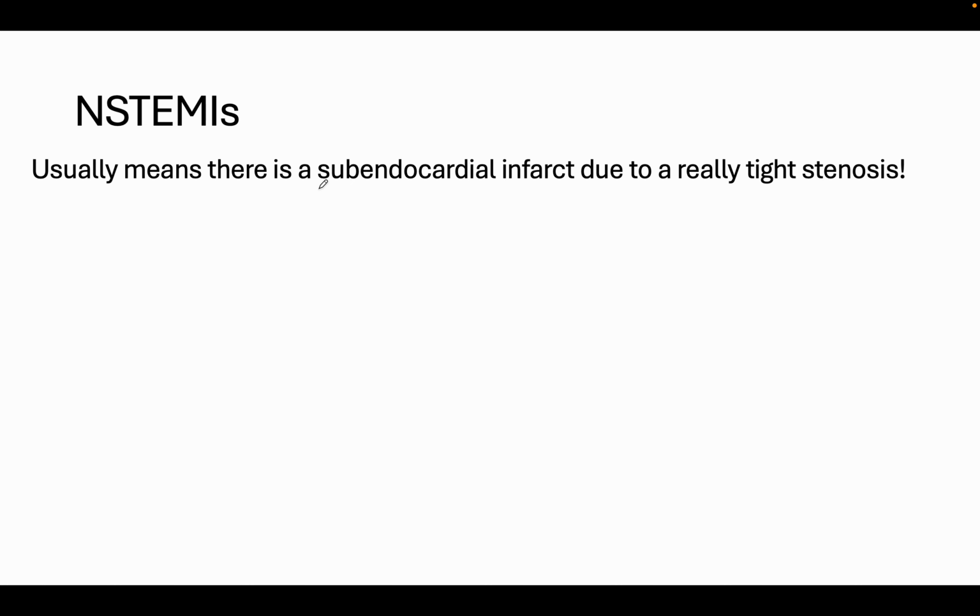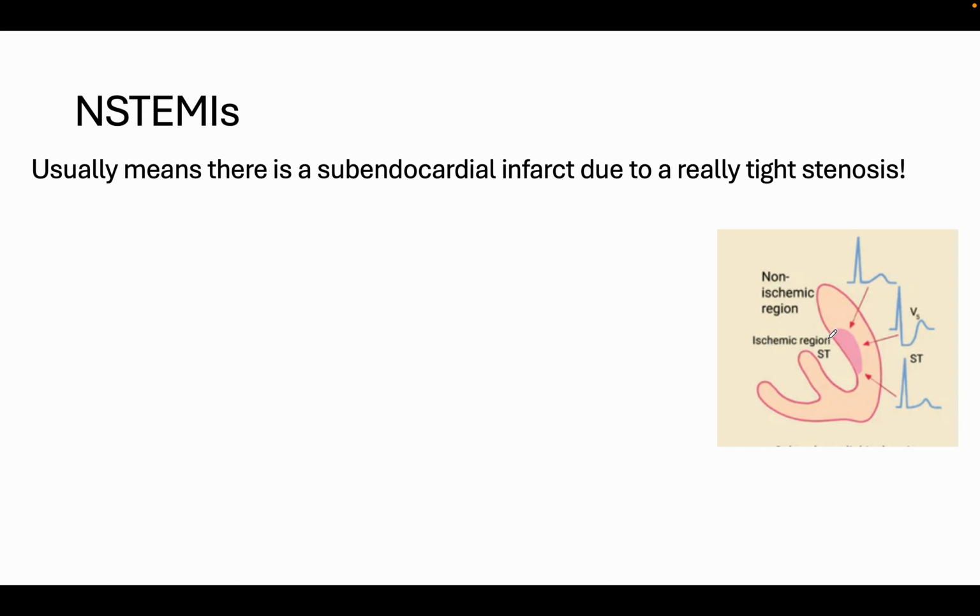So let's now look at the concept of an NSTEMI, a non-ST elevation myocardial infarction, which, as the name suggests, is a myocardial infarction where you don't get any elevation. And this suggests a subendocardial infarct, which is not a full thickness infarct, but a partial infarct through the wall of the myocardium. And that's really suggestive of a tight stenosis rather than a full blockage.